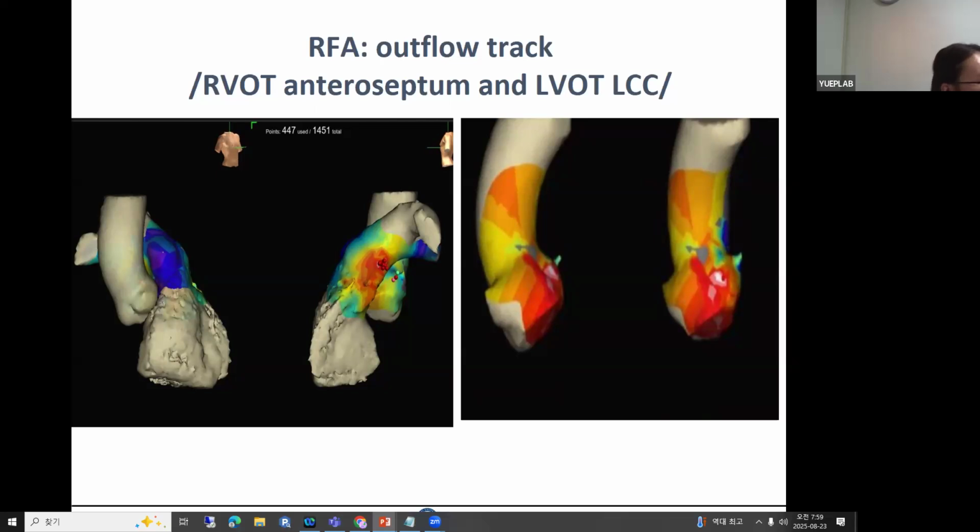Okay. So when you look at this type of 3D map next time, this is fairly distant, and these are two completely different structures with almost equal timing. You have to make sure that the site below is not earlier, maybe spreading this way. Okay. So always, with 3D mapping, when you finish, it's important to look at it. Does it make sense to you?